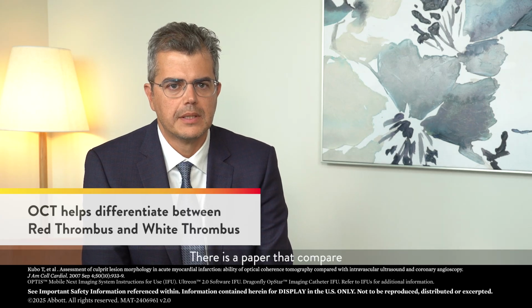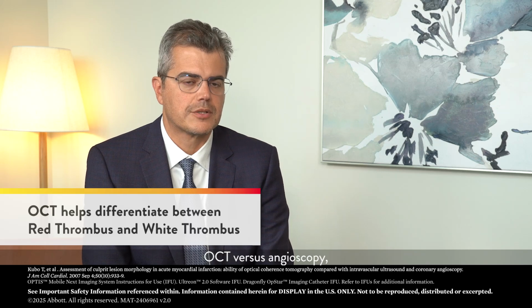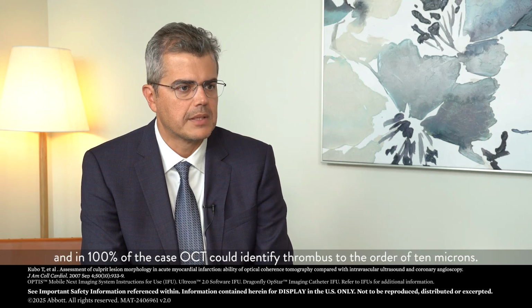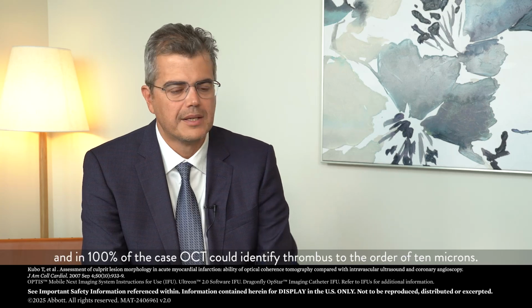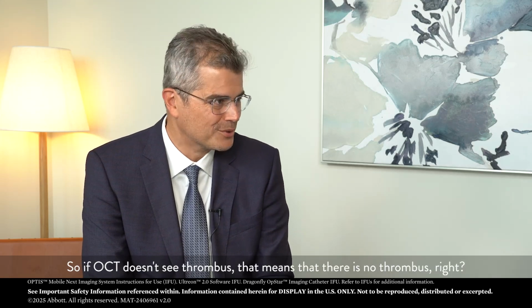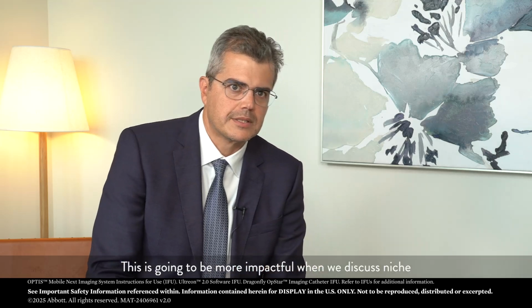There is a paper that compare OCT versus angioscopy, which would be considered the gold standard to detect thrombus. And in 100% of the cases, OCT could identify thrombus to the order of 10 microns. So if OCT doesn't see thrombus, that means that there is no thrombus, right? This is going to be more impactful when we discuss niche OCT applications like ACS population, etc.